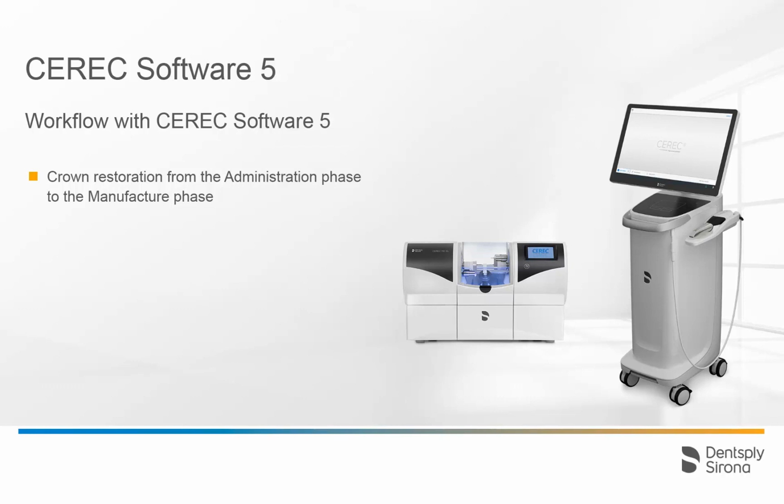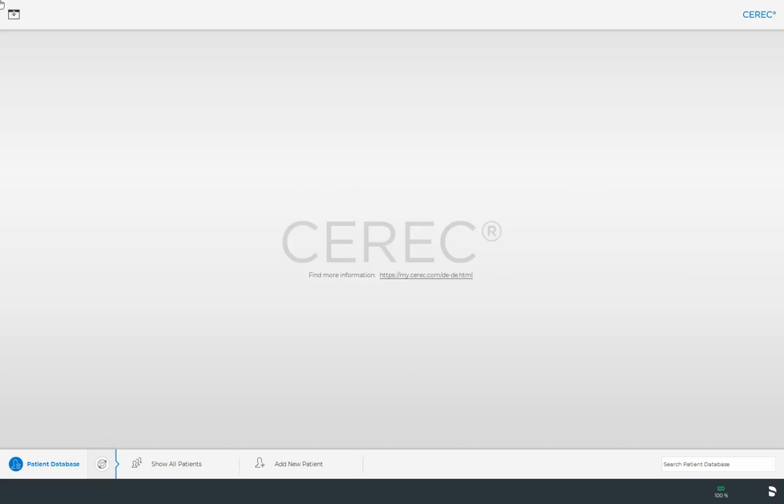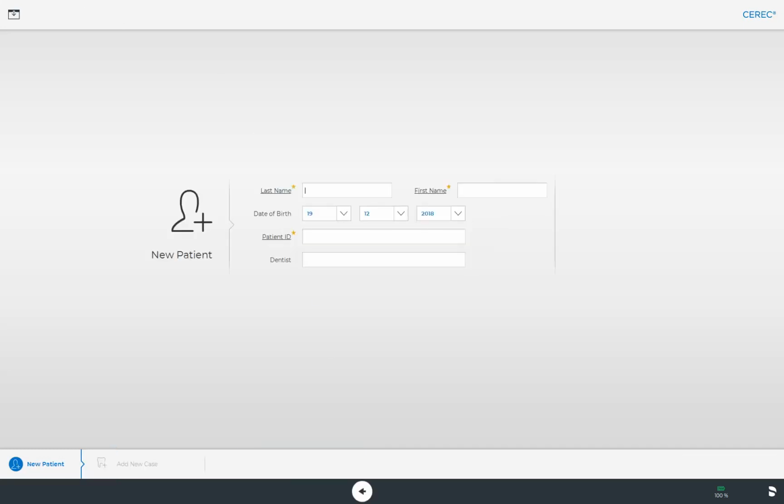In this tutorial, we will demonstrate the workflow from the administration phase to the manufacture phase in the case of a single tooth restoration. First of all, we set up a new patient. We enter the last name, first name, if needed the date of birth, a patient ID, and the name of the treating dentist.